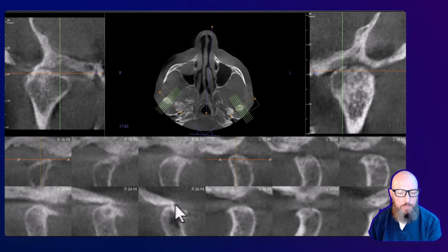See the loss of joint space there as well. Almost looks like bone-on-bone contact. So the more you get that loss of joint space, if you do get the bone-on-bone contact, eventually you could get ankylosis and the patient would be completely locked up. The left joint, it has better joint space, but still erosions. Ely cyst, or you might describe that as erosion through the medial pole of the condylar head.